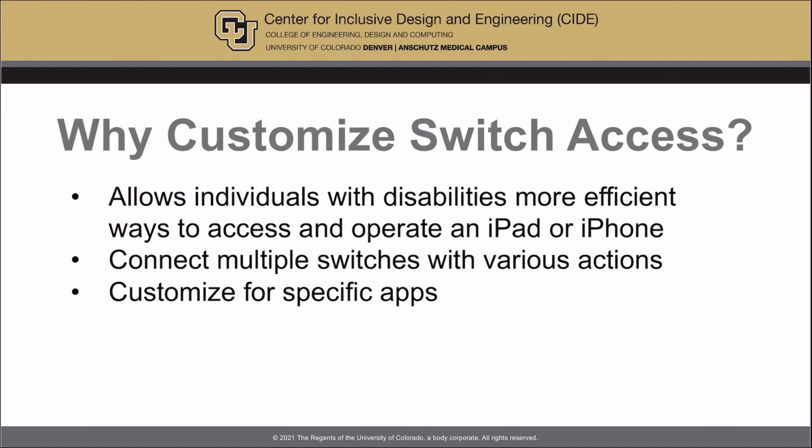Customizing switch access allows individuals with disabilities more efficient ways to access and operate an iPad or iPhone by connecting multiple switches, assigning various actions to those switches, and even customizing recipes for specific apps.